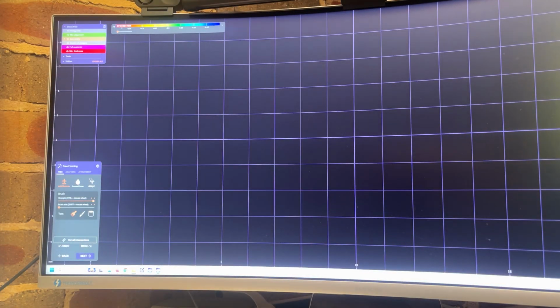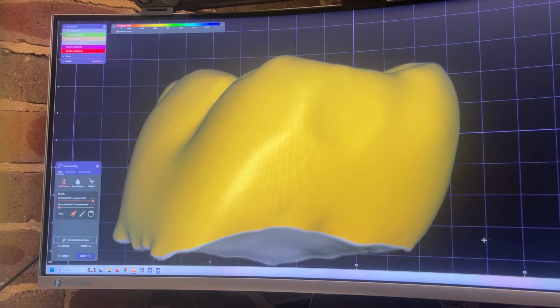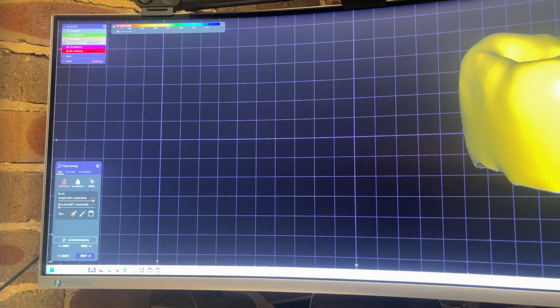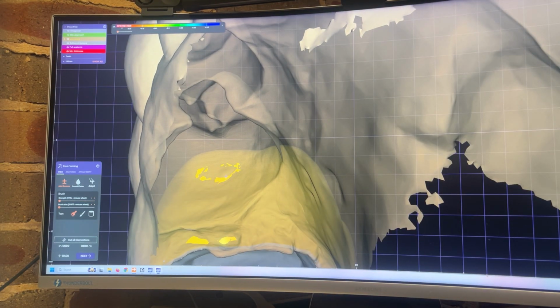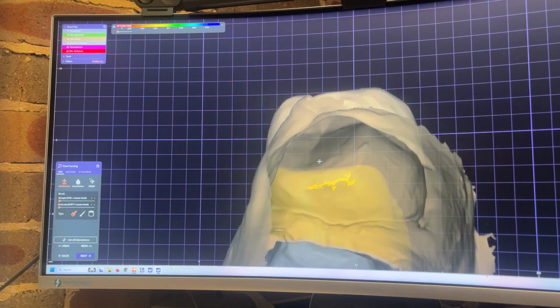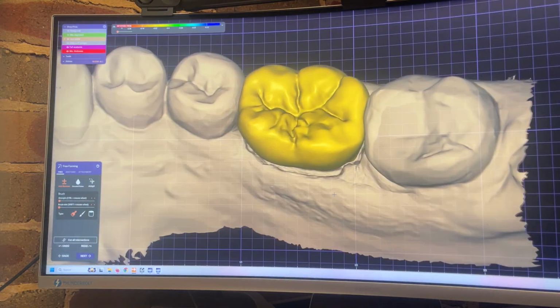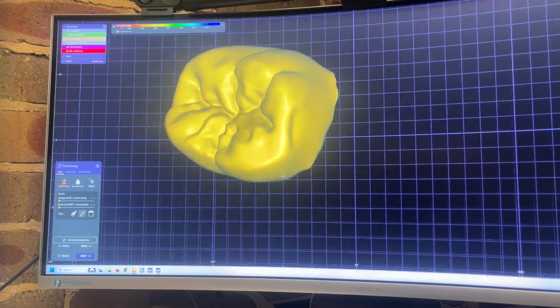And here too, it's got an undercut here, see that in there? Slight, yeah. So I'm going to smooth this out here. Double check. Juice it here a little bit. And then it's fine here. Take this away here.